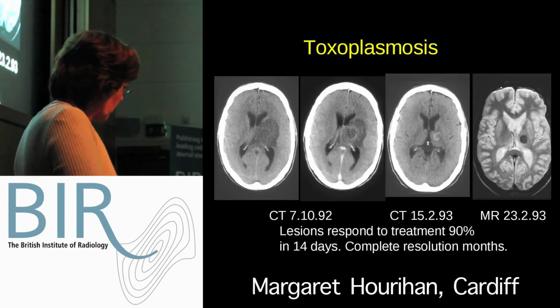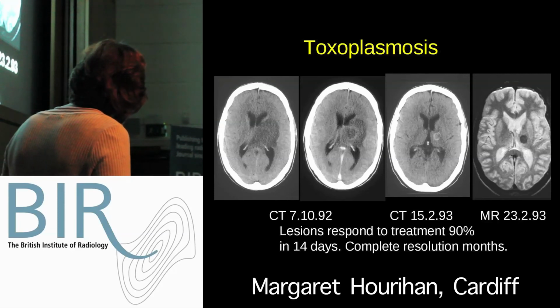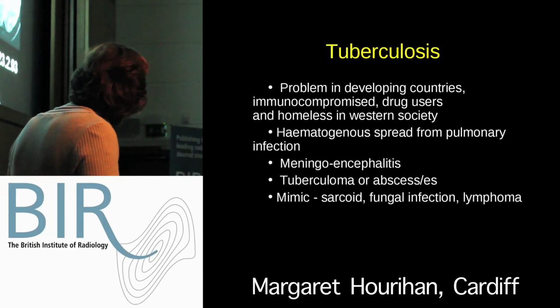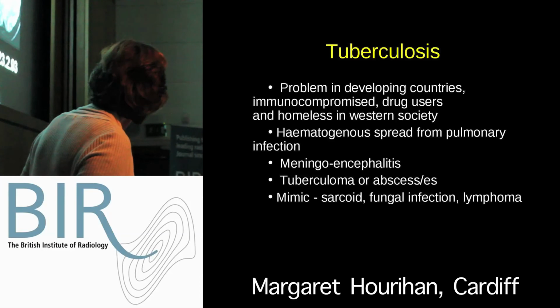And this is such a patient who has a CT scan with this large lesion. The capsule of the toxo hasn't well formed yet, but that was the diagnosis. He was treated empirically for 2 weeks, and he responded to treatment. These are the end results after several months of treatment.